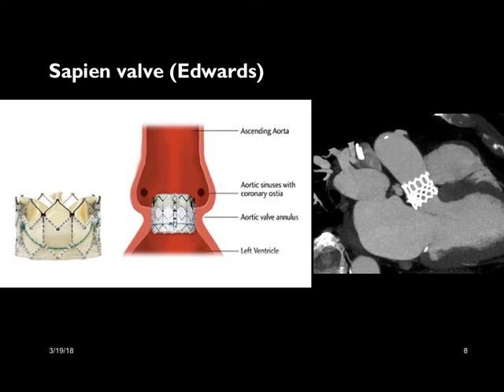So the important thing here is it's centered on the aortic annulus, and unlike the CoreValve, the device itself does not go above the level of the coronary ostia. It actually sits just below.